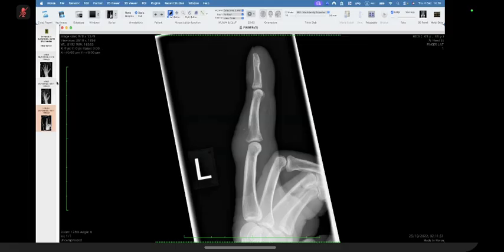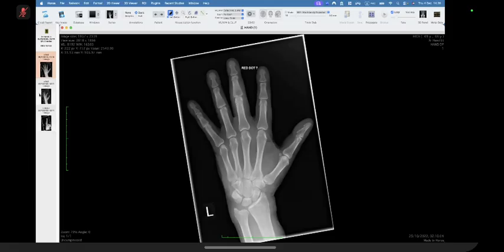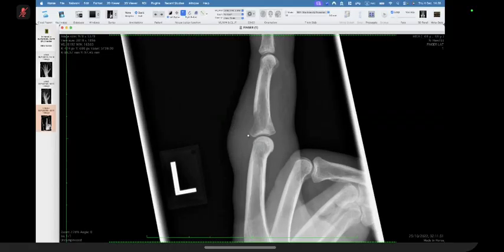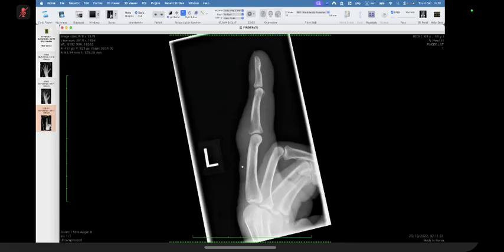This is actually an interesting case because you look at the frontal view and think you're dealing with an enchondroma, and then you go to the lateral view and you're not dealing with an enchondroma, and your mind starts playing games with you. So now you have to think of proper differentials. There is a periosteal reaction, and it's not exactly lamellated. It's almost a sunburst, sun ray sort of periosteal reaction. So this is an aggressive process, not typical for tenosynovial giant cell tumors, which are fairly indolent tumors. Could be an infection, yes, but this actually turned out to be a metastatic deposit from a lung primary. This patient had a lung primary, and this was a metastatic deposit.